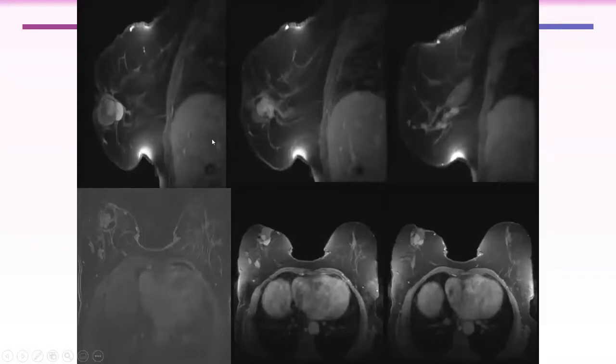And here the soft component is intensely enhancing, with enhancement of the cyst as well as enhancement of the nipple areolar skin complex. And the smaller lesions demonstrate solid enhancement and are arranged into a segment. Yes, a channel.